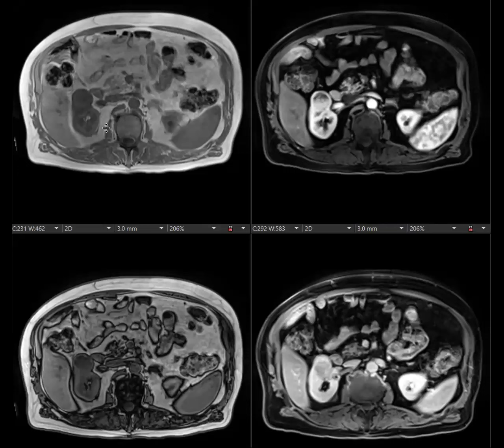Renal mass, MR for characterization. And this will be a good one for CCLS. Yes, this is a good one for CCL. And I'll tell you what I did. I actually left it as is, you tell me while I'm showing it. Yes, let's do it.